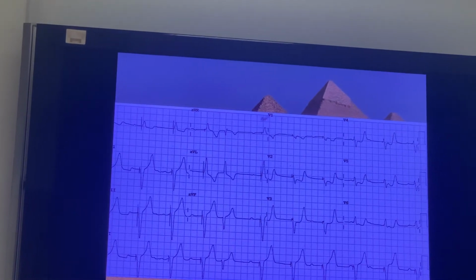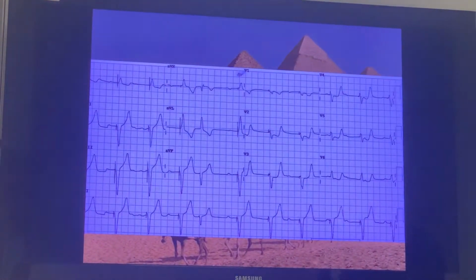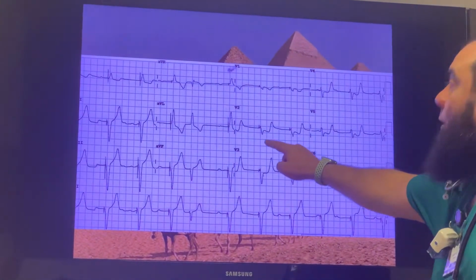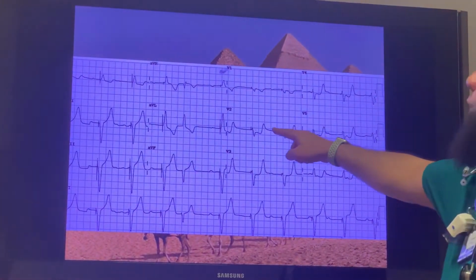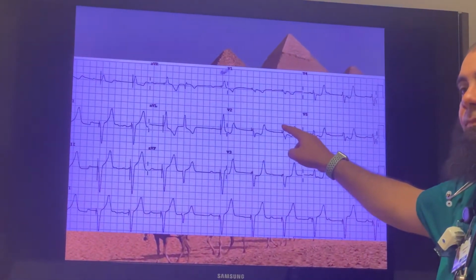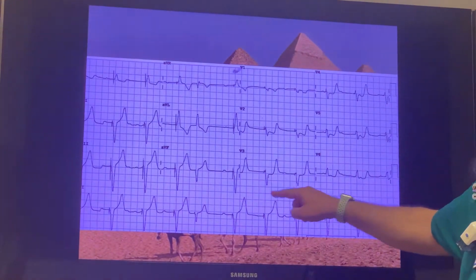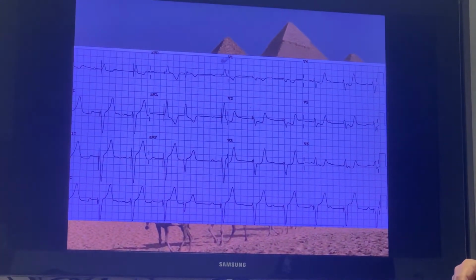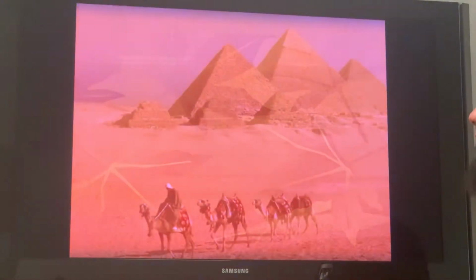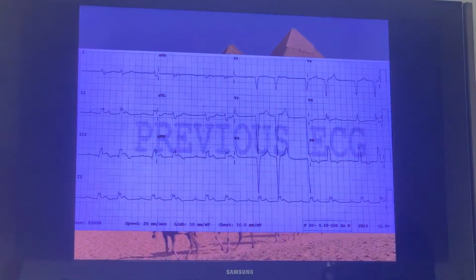Is the left bundle pacing rhythm? It is pacing rhythm. Just same rules apply. Same rules apply. Pacing rhythm and left bundle branch block. You can see the complex is down and the ST is down as well. Usually in V1 you find it down but with upright ST and T wave. Same way here. Depressed ST going in the same direction of the complex. Is that clear? Okay. Okay, what's this? Someone to pick up any abnormality.